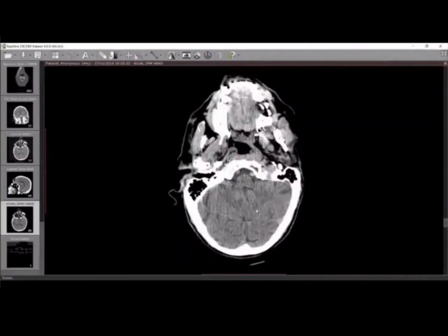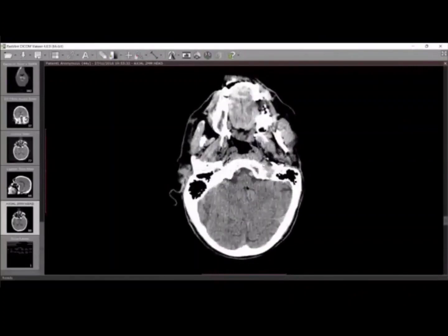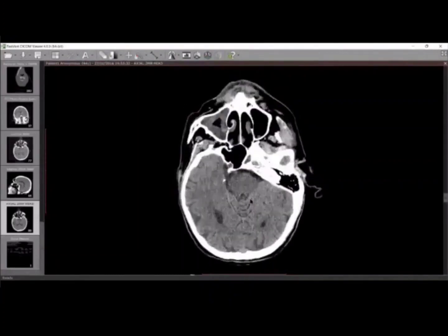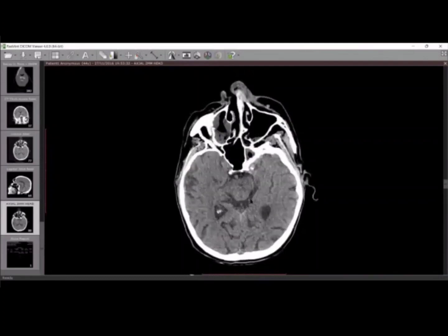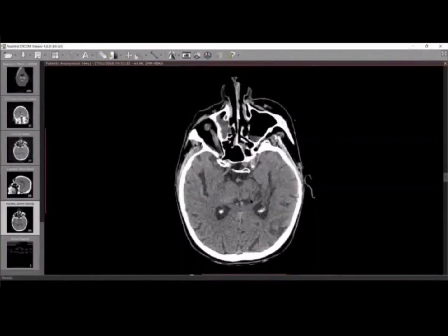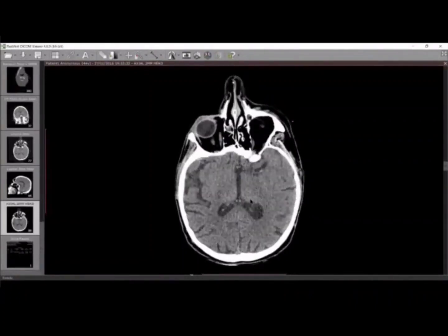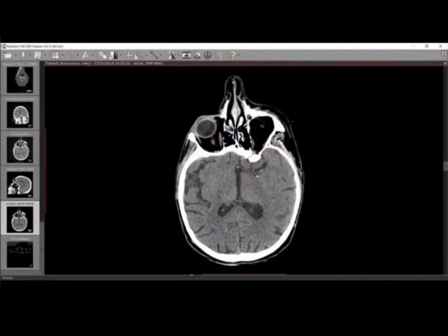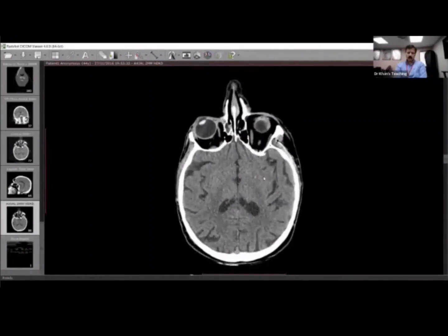I also feel that the cisterns around the brainstem are relatively effaced. I'm having a second look. I'm looking for any hemorrhagic contusions. I'm trying to look. There seems to be a dense left-sided MCA sign. Don't worry, this is a trauma patient.